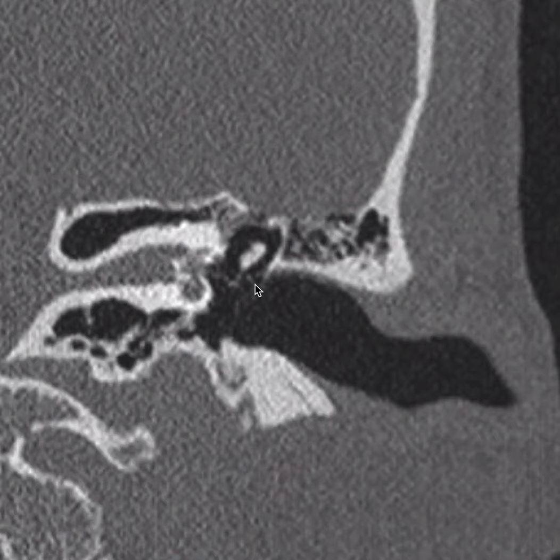Behind the tympanic membrane is the middle ear cavity. The middle ear cavity consists of the epitympanum, mesotympanum, and the hypotympanum. The epitympanum is everything above a line drawn between the scutum and the tympanic segment of the facial nerve right here. So this line delineates the inferior boundary of the epitympanum.